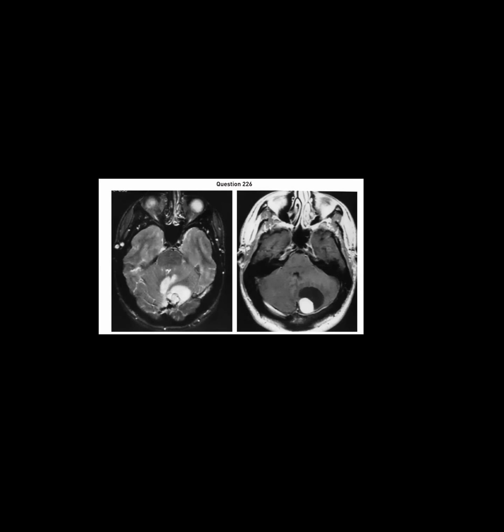Yes. Okay, so take a look at this case. They showed this on the past 2 RIDE exams. Look at the posterior fossa, there's a cystic lesion with a mural nodule in the cerebellar hemisphere. The most common cerebellar mass in an adult is actually going to be a metastatic lesion. However, if you see a cystic lesion with a mural nodule that's a primary tumor, there's a narrow differential for that.